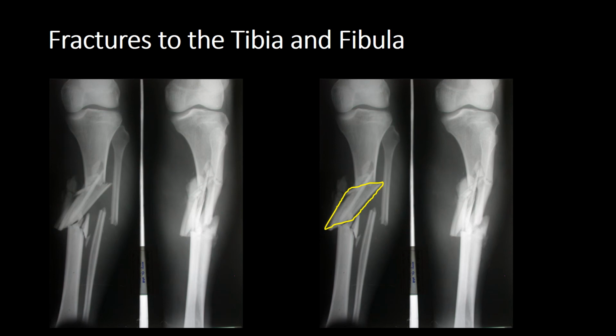But the reason why I want you to look at this is because it has a very large segmental fracture. And so here we can now see quite clearly how it's going to be difficult getting that intramedullary nail down through the proximal portion, then through the segmental fracture, and then out through the distal portion. Remember, we always describe the distal fragment in relation to the proximal. So this is the fibula, so therefore this is the lateral border, so therefore this is the medial border. So we can see that there's marked medial displacement and there's overlap of the fracture site as well.